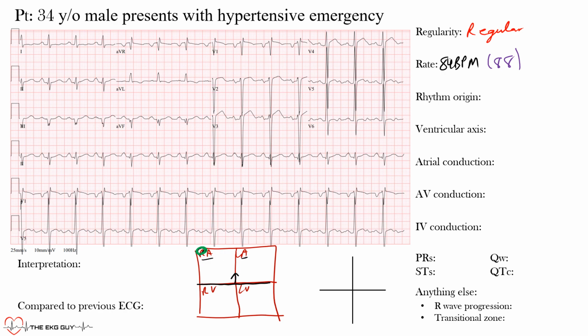If you say normal sinus rhythm, that means you have a normal rate, which is age-related, in this case between 60 and 100 in adults. Sinus bradycardia is one where the rate's below 60 and sinus tachycardia above 100. So regardless if it's normal sinus rhythm or sinus bradycardia or sinus tachycardia, we're saying that the rhythm is originating from the sinus node, at least one of the rhythms, right? Sometimes you can have more than one rhythm going on.